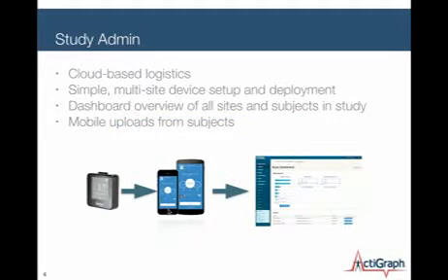I did mention the mobile uploads. Here's the bullet. So we do handle mobile uploads, 60-second Epoch only, up to the study admin system. So we're talking about Epoch level data coming in over mobile uploads. And for most outcomes, that's sufficient, especially if you're just looking for compliance, general physical activity measures over time. It's more than sufficient.